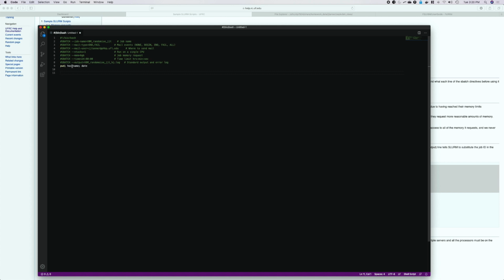The host name is important, and the date can be important in case there were any issues. If there was an error and you didn't know why, you tried running this again, or you got an error on a particular process, it could be that the server has gone bad, and so it's keeping a record of it.